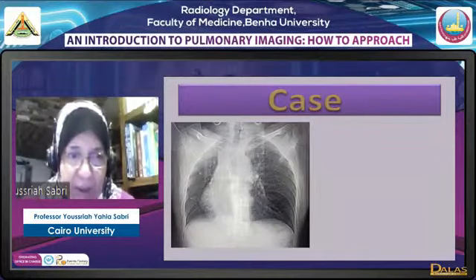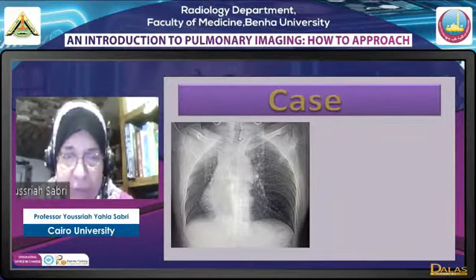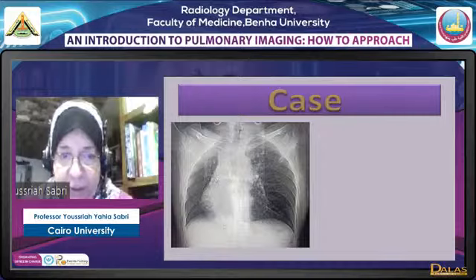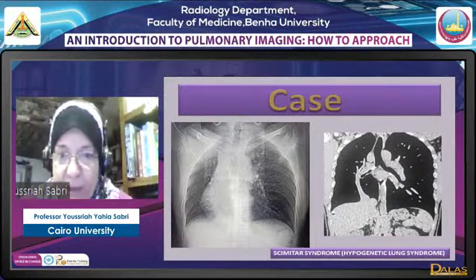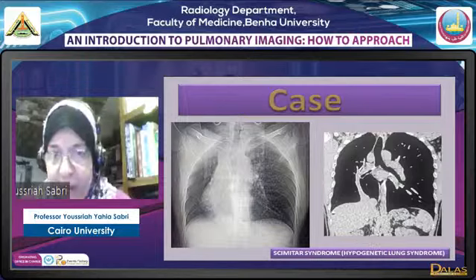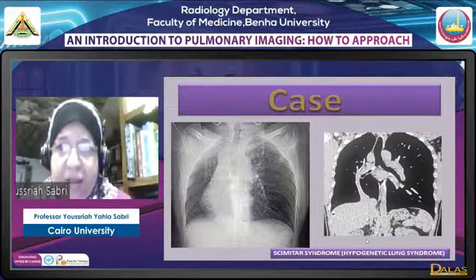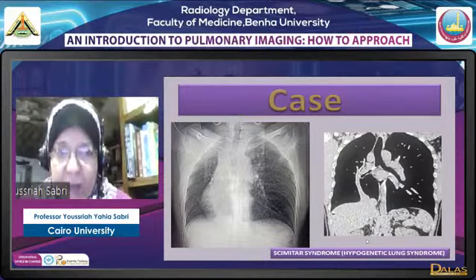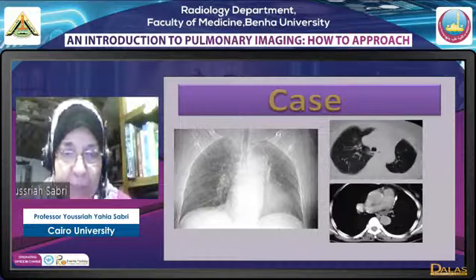Another case here, we have again a small lung, shift of the mediastinum and heart, abnormal configuration, and as you can see here, there is a suspicious vascular structure behind the heart, scimitar looking actually. And this is a coronal image. This is scimitar syndrome, what we call a hypogenetic lung syndrome, which is considered a partial anomalous pulmonary venous drainage. Again, a small hypoplastic lung.